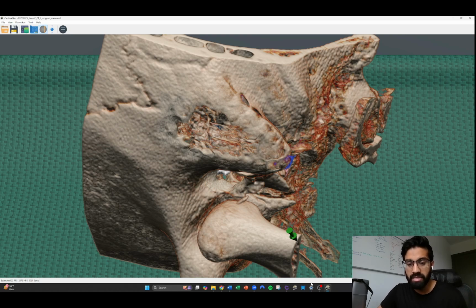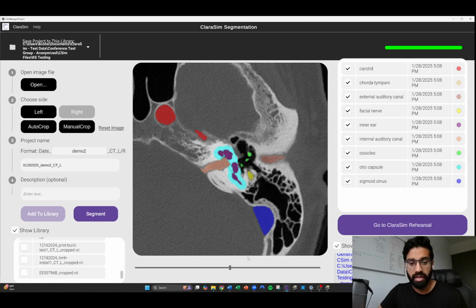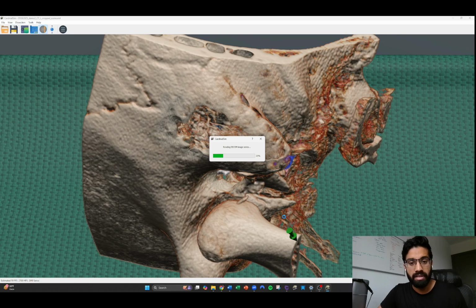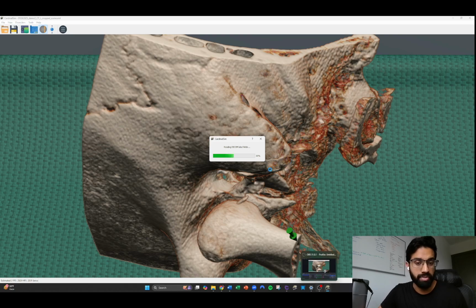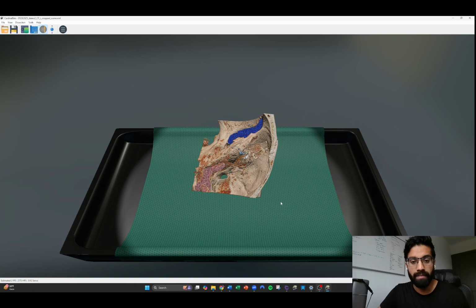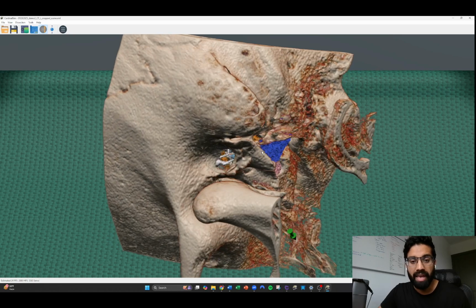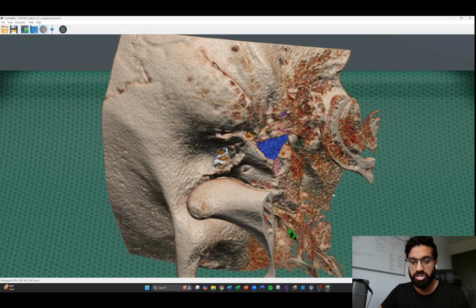And what that means is instead of looking at an image that looks like this, but without the coloration, just the plain black and white image that we had before, they can instead look at something that looks like this. And I just reset it. But yeah, they can look at something that looks like this and interact with it and see how that changes over time.